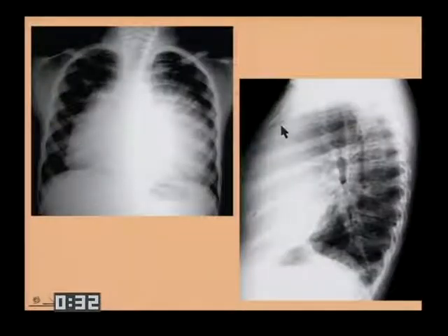The thymus can enlarge after stress. It can enlarge in children with hypo or hyperthyroid syndromes. This is a large cardiothymic shadow, a term a lot of pediatric radiologists use because it's sometimes difficult to distinguish the contour of the thymus from the heart, and you would go through a differential about cardiac enlargement, pericardial disease. This turns out to be thymus in a child with HIV positive disease.